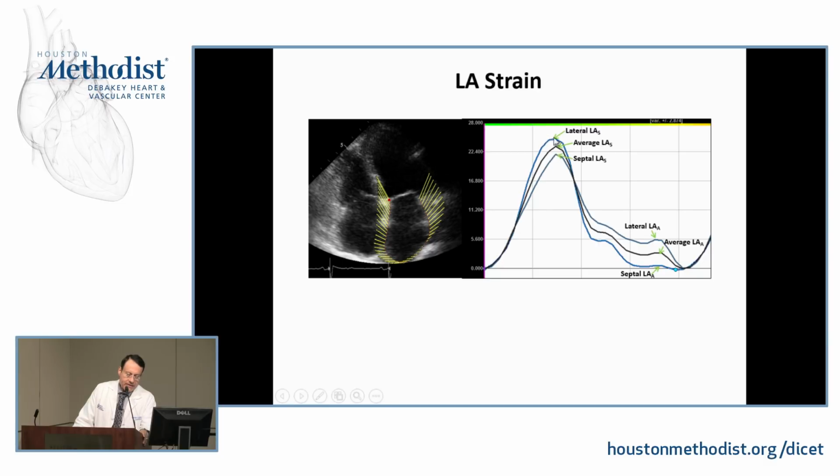So during systole, the left atrium is filling with blood. This is corresponding to the increase in LA volume and to the rise in LA pressure with the V wave, if you would. This is the LA reservoir strain. Then you have the mitral valve opening, the LA volume goes down. You have an early diastolic, not very clear here, strain, and a late diastolic strain. That late diastolic LA strain is related to LA contractility or LA booster pump function and can also be analyzed.